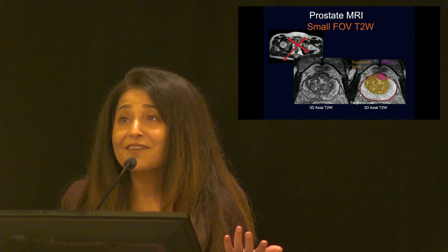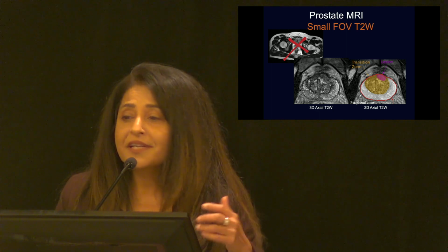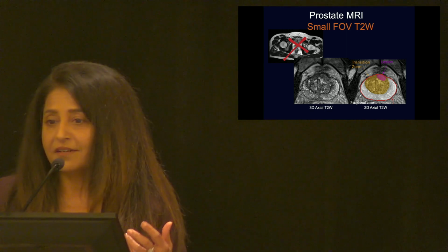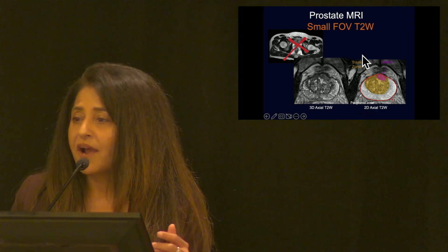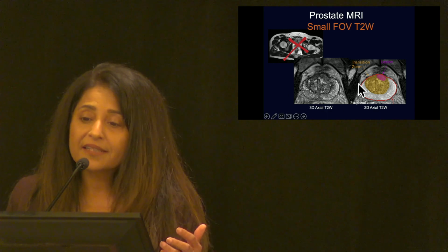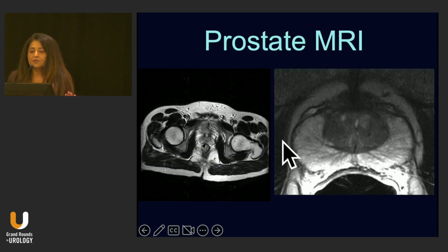This is still happening, unfortunately. And we can talk about 2D, 3D, and we have very sophisticated radiology meetings as well on prostate imaging, et cetera. But all that we can decide later. We have to first make sure we are doing real prostate MRI everywhere, not just at big centers, and quality is an issue. We'll talk about 2D and 3D later, but you can see this. There's a lesion anteriorly that was never seen because it was not a true prostate MRI.